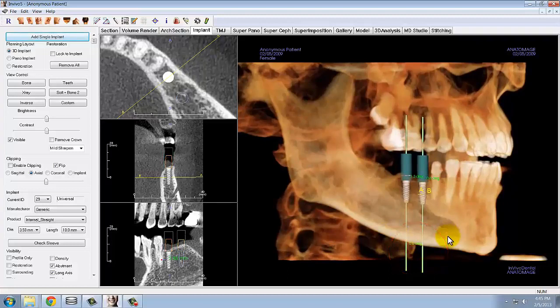Generally, it is best to have implants parallel when case planning for a bridge or the anterior implants for an all-on-4 because they provide more stability. If you wish to only have some implants parallel, place the parallel implants first, parallel them using the Make All Parallel Implants tool, then go back and deselect the option. After that option is turned off, you will then be able to place other implants that are not parallel, but the ones that were set to be parallel initially will remain so.